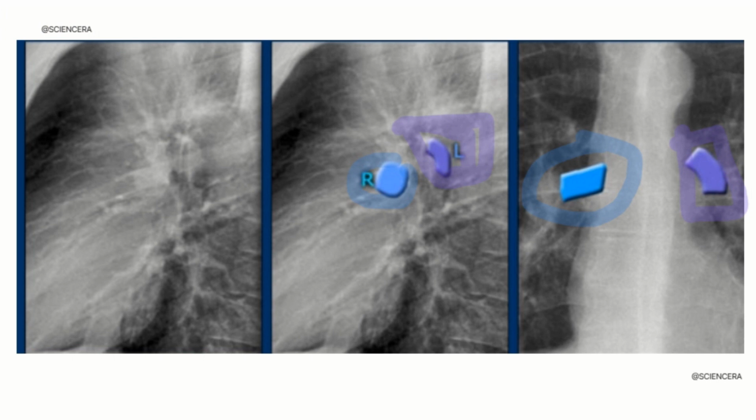When doctors look at the side view of the X-ray, the side view is also known as your lateral view, they can see the normal structures in the lung area. This helps them spot any problems. In this case, on the front view of the X-ray, there is something called hilar enlargement.